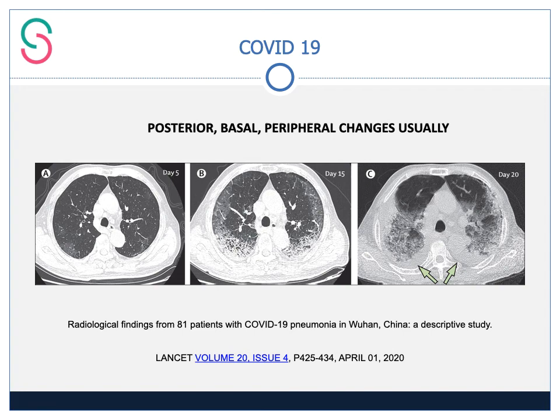Just a few slides concerning COVID-19, as this is a current and pressing problem. There's plenty of evidence over the last year that there are some fairly distinctive features of COVID-19 lung disease, including the fact that there seems to be a progression from fairly normal lungs to ground glass changes that are typically basal, posterior, and subpleural, and this progresses through to a mixture of ground glass and consolidation, leading to frank consolidation. There also appears to be a high risk of pneumothorax, and of course the development of conventional bacterial pneumonias.